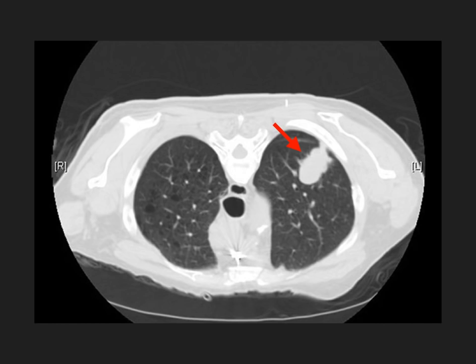That is all the CT scans I have for this video. Again, in summary, I want you guys to remember that the highest yield CTs are going to be lungs, heart, brain, and abdomen. I would be able to differentiate esophagus from vena cava and from aorta. I would be able to orient yourself and identify, when you're in the abdomen, the liver, the spleen, and both kidneys. If you can master that, then move on and also be able to see the pancreas. But again, liver, spleen, kidneys are going to be your big 3.